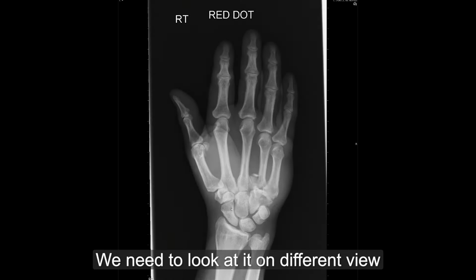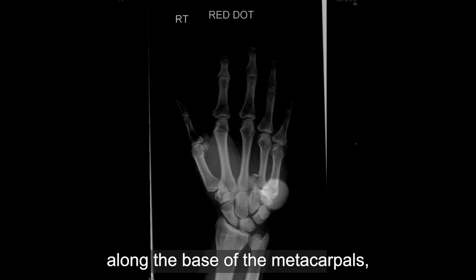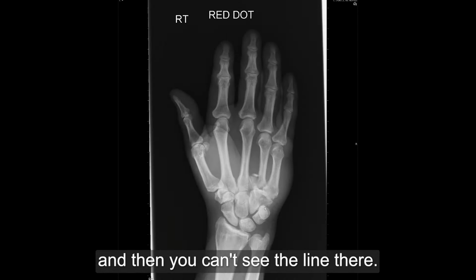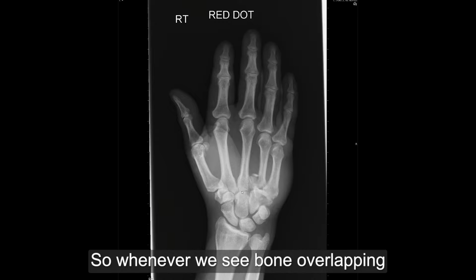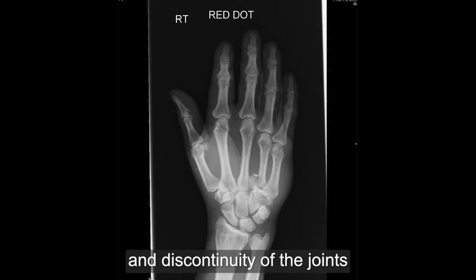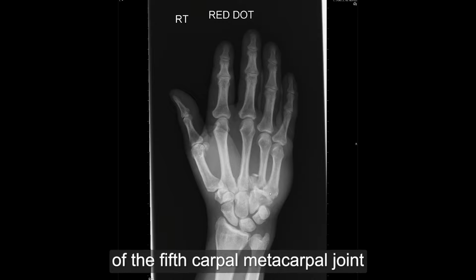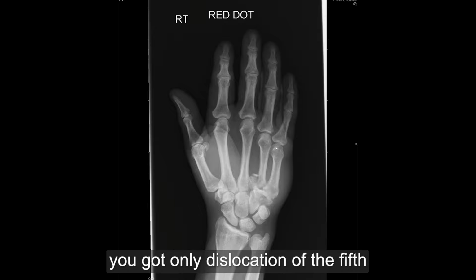We need to look at it on a different view because one view is too few. And if you look here and follow this other line along the base of the metacarpals, you can see there's a straight line here, and then you can't see the line there. Usually it's a continuous line between the joints. So whenever we see bone overlapping, discontinuity of the joint and foreshortening of the fifth digit, it means there's dislocation of the fifth carpo-metacarpal joint and potentially the fourth. Usually it happens at both at the same time, but in this case you've got only dislocation of the fifth carpo-metacarpal joint.